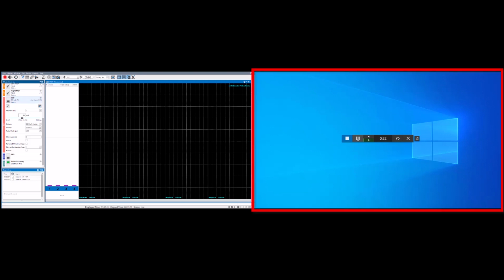Also, an instructor may use the simulator with one or more trainees by manipulating the control panel to simulate a series of events. This could be achieved in a number of ways. 1. The instructor starts a case as recorder and connects a second monitor and drags the control panel out of view, only displaying the recording screen to the trainee or trainees.